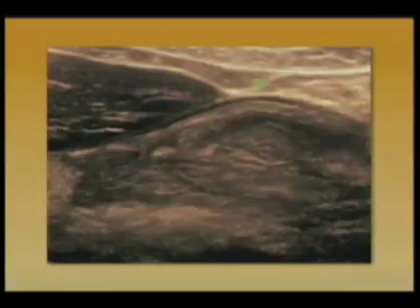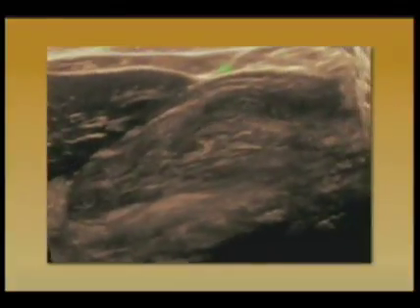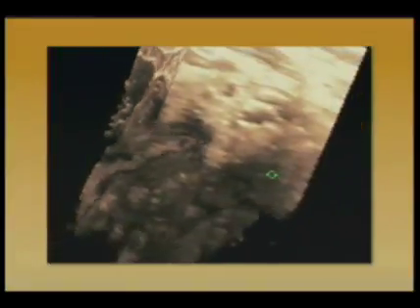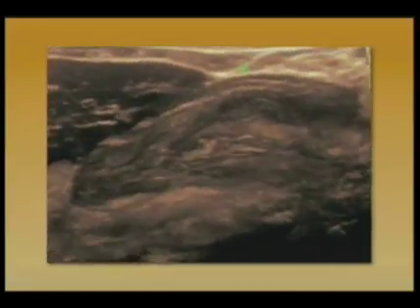And in the 3D volumetric view from the same case, we can see the gastric lumen quite well, even though it's not that greatly distended, and we can see the rugal folds along the greater curve of the stomach at the back. As I rotate this around, you can see those rugal folds. There's no abnormal pathology in this case.